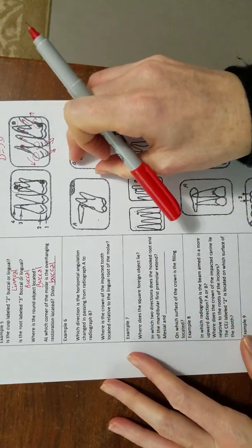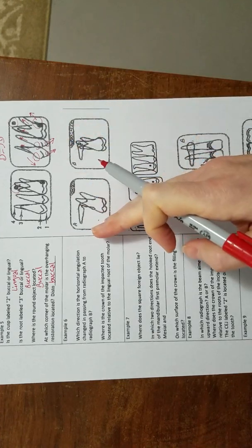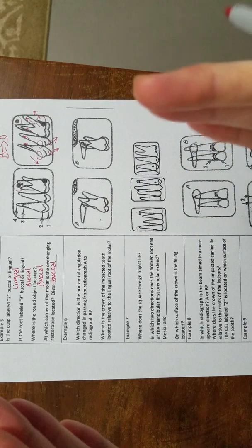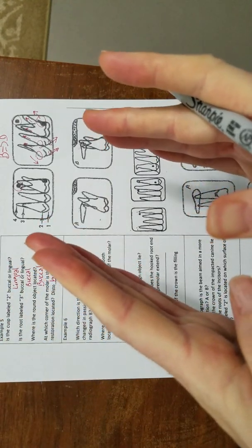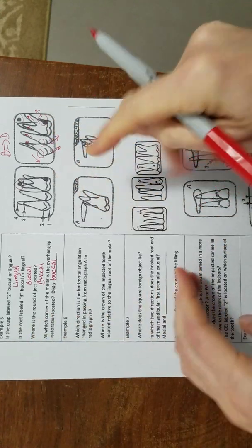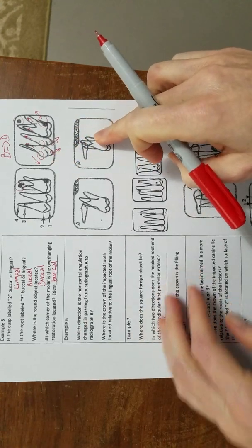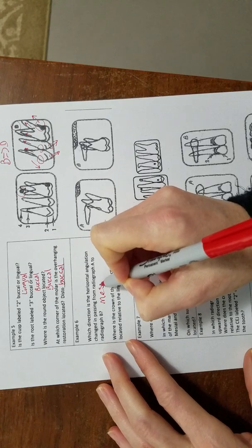So if you take your most straight on shot and compare it to the next one, sometimes that can help you. But basically everything was like this. If you look at my hands, everything was kind of like this, and then it moved straight on from A to B. So it moved from distal to mesial to be a more straight on shot. So then the answer here would be mesial.